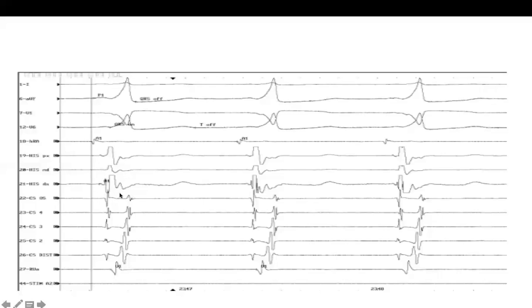Now you mentioned AHV a while ago. In your description you said AHV. Do you really see AHV here? No, I see AV actually. AV, and the H is hidden, no clear H. Maybe the H is somewhere here, and I cannot say 100%. But what I see is that the V is very early and almost fused together.